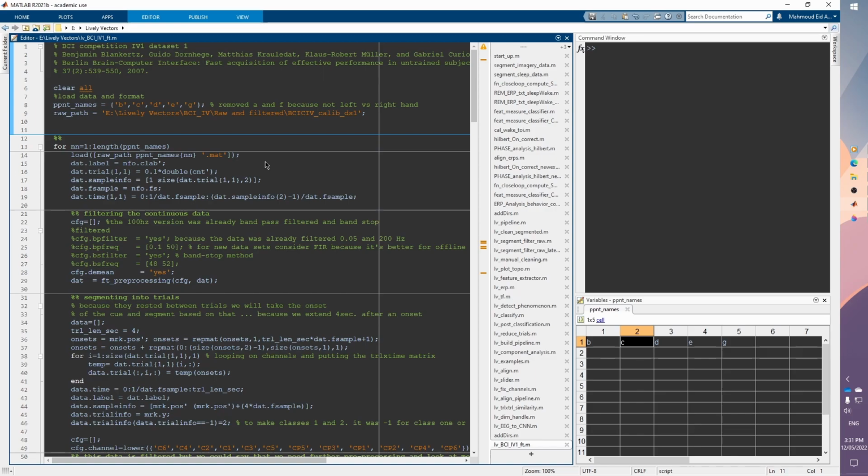in order to clean our EEG data. So in this coding session, I would like to start with some general tips that might be helpful to some people. And I would like to start with talking about Matlab and how I made it look like this and why I make it like this, because I felt like it was really nice to have the interface looking like that, and it was really helpful in the long term, and perhaps you might think the same thing.